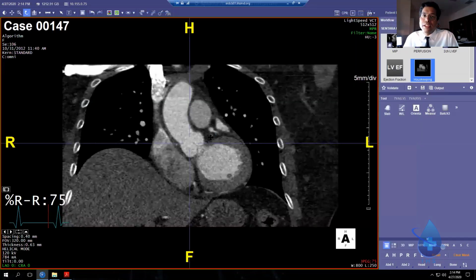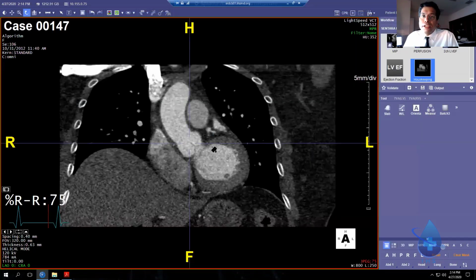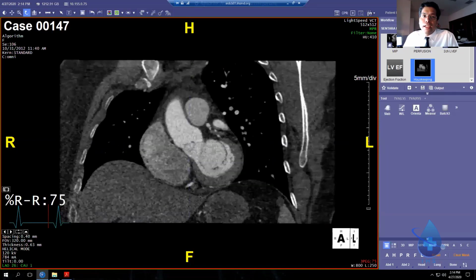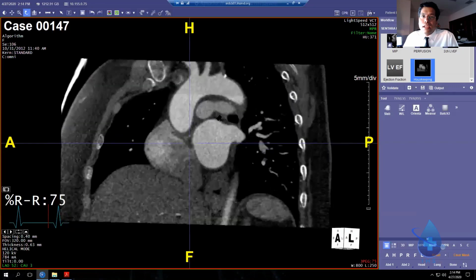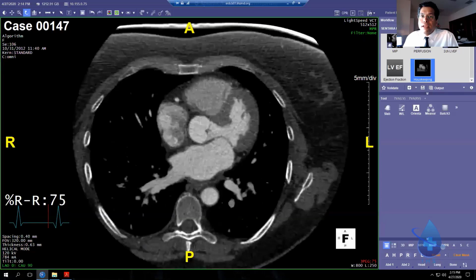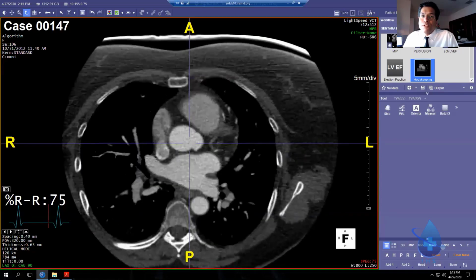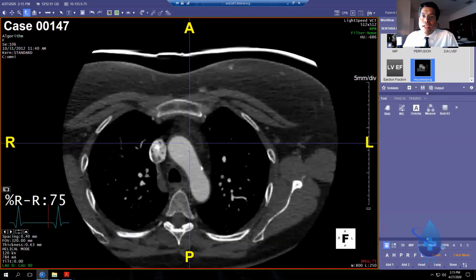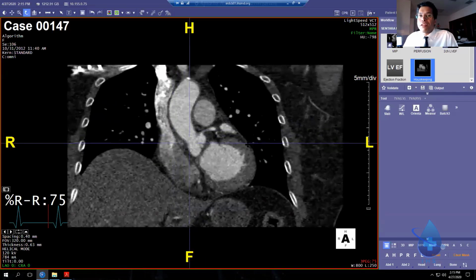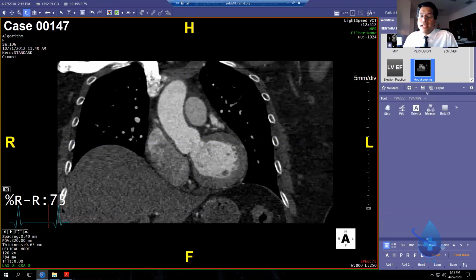And again, the way you do it is you put the aortic valve in your crosshair, you cut plane AP, you switch to candy cane, and do it candy cane. And then you click F and do it the way the radiologists do it. That gives you 3 planes of the aorta. And if you're doing 3 plane views of the aorta on a gated CT scan, then that is the gold standard for the aorta. There's nothing better in 2020 than a gated aorta with 3 plane views.